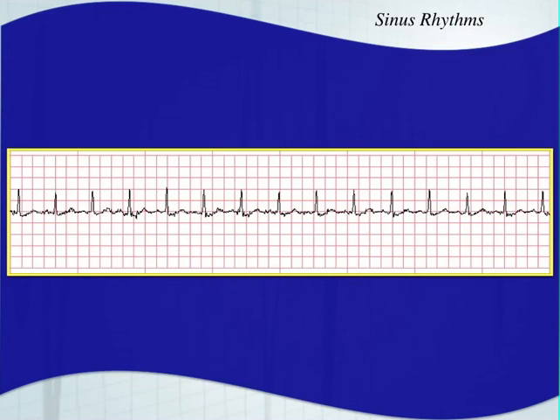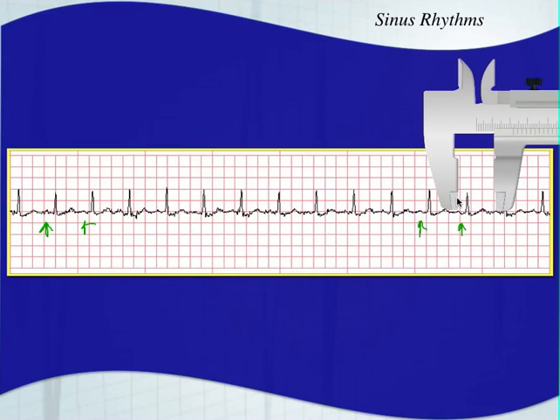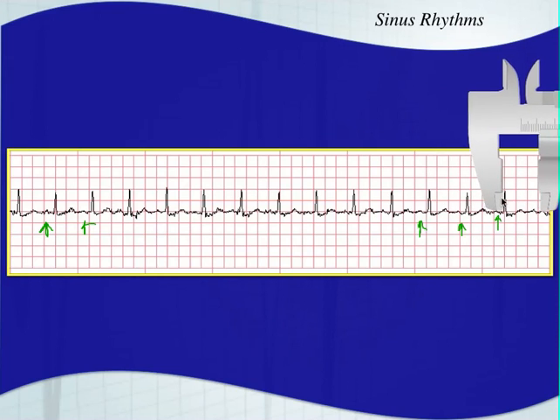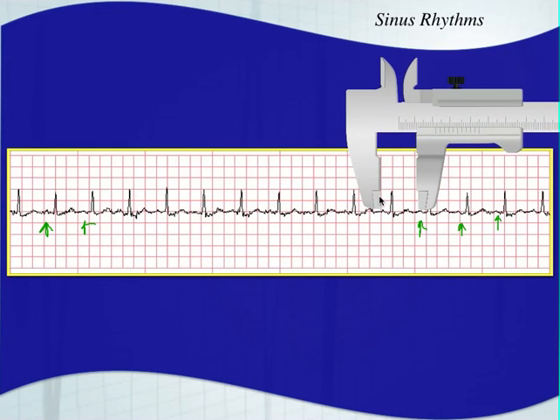What is it? Well, do we see P waves? Now, at first you might wonder if you see P waves, but I will assure you that there are P waves right there. Now, what might make it easiest to do is find the P waves that stand out the most. So, towards the end of this EKG, I think that that one stands out pretty good, and that one stands out pretty good. And P waves will always march out. So, if you find the highest point of the P wave there and the highest point of the P wave there, and you try to just march it out to find the next one, you know that there's now a P wave probably hidden there. And that will help you find those hidden P waves. You see that there's one there at the bottom of that. If I go this way, I can see that there's one there.